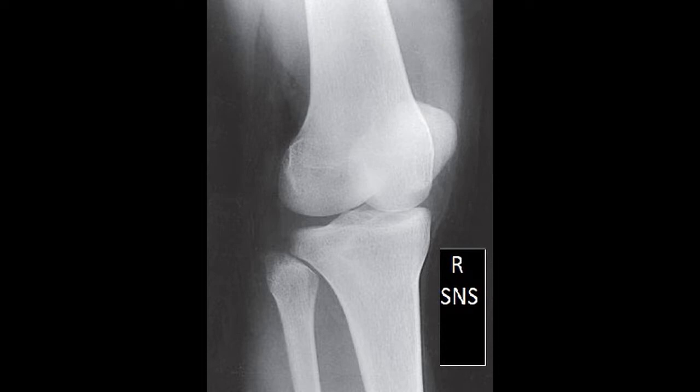So you can tell that that's from the medial rotation, and the knee joint appears open, and you can see all the soft tissue around the bone, and you can see the trabecular detail of the bone as well. I took off the 5 degrees of caudad angulation in my central ray because that's what we do at our clinic, but I know that that is a requirement of Merrill's, so I just wanted to make mention of that. That wraps up my AP oblique projection with medial rotation.